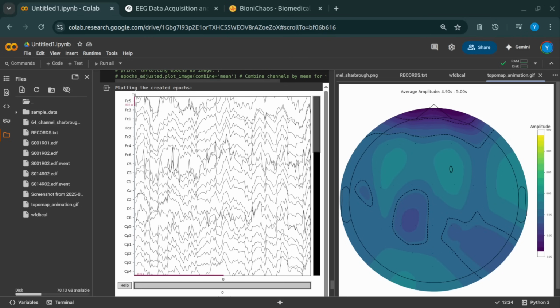For this deep dive, we faced 3 core technical hurdles right out of the gate, and honestly, they're common tripwires in this field. Think of them as the foundational building blocks you have to get absolutely right, otherwise your whole visualization just won't make sense. The first was ensuring that the specific electrode names in our dataset, like the ones labeled in raw.info ch_names, perfectly aligned with a standard electrode map, like the standard 1005 montage.